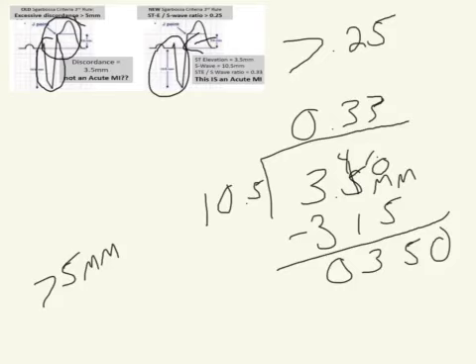And this is great too if we have a low voltage EKG. We've got to remember it's more important to look at the relationship between your S wave and your ST elevation rather than the actual amount of elevation. We want to watch the ratio between the two, and that's going to help our sensitivity go up quite a bit when trying to identify an MI.